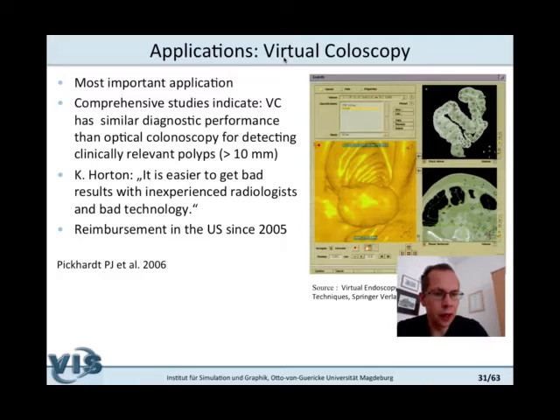How correct are the visualizations that we see in endoscopic views? Or one could also say, how much can we rely on what we see there? If there is a certain change in a wall, is this really something that's inside the patient's body, or is this an artifact from CT imaging or from image processing?